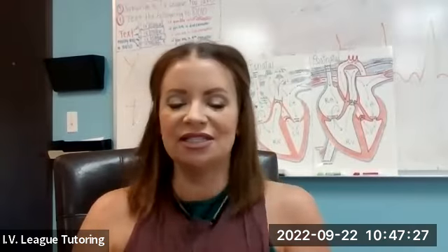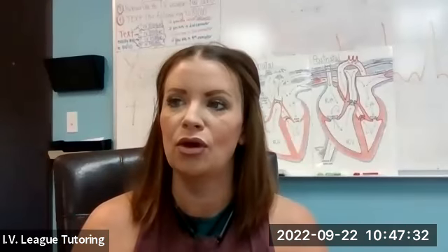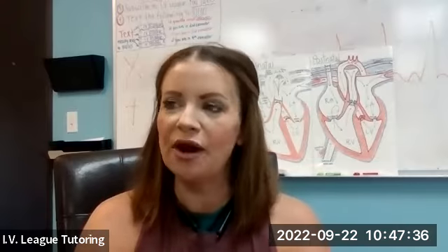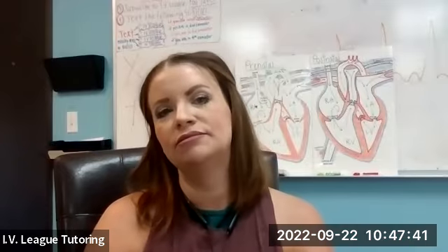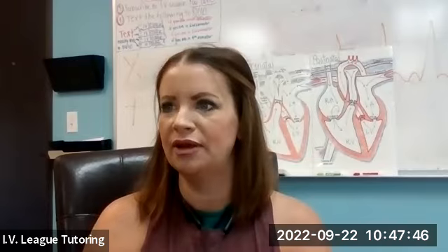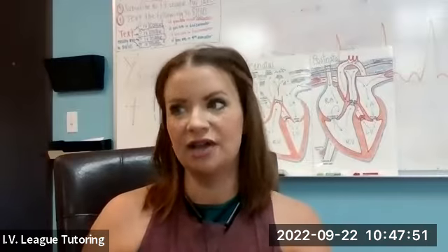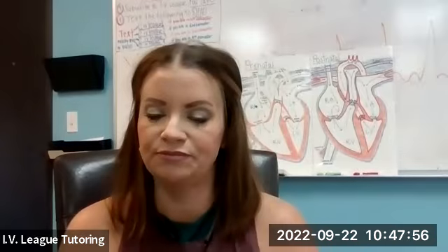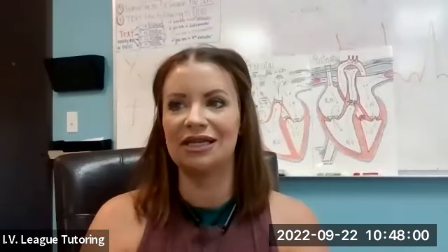In sinus tachycardia, heart rate is greater than 100. PRI is 0.12 to 0.20. QRS complex is less than 0.12. Are they stable? Probably. However, sinus tachy can end up going into VTAC, so it is something we have to watch for, and or SVT.